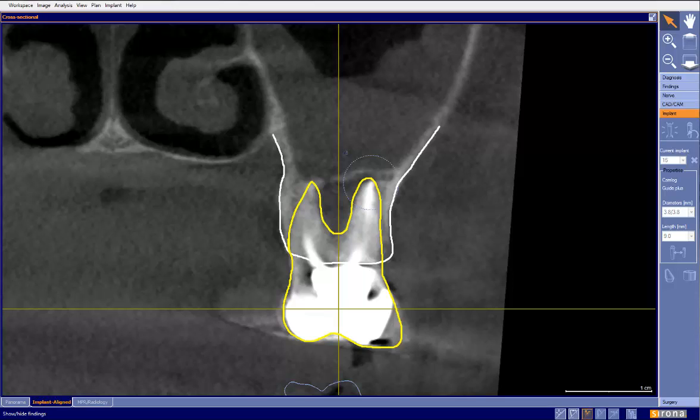So now what this leaves us is a good visual representation, and I'm going to use green right here to tell us where we have bone to create stability. And I know we're not going to use this bone over here that I'm coloring green right now, but just to give us an idea of that. So that's what we have left to be able to use for stability.